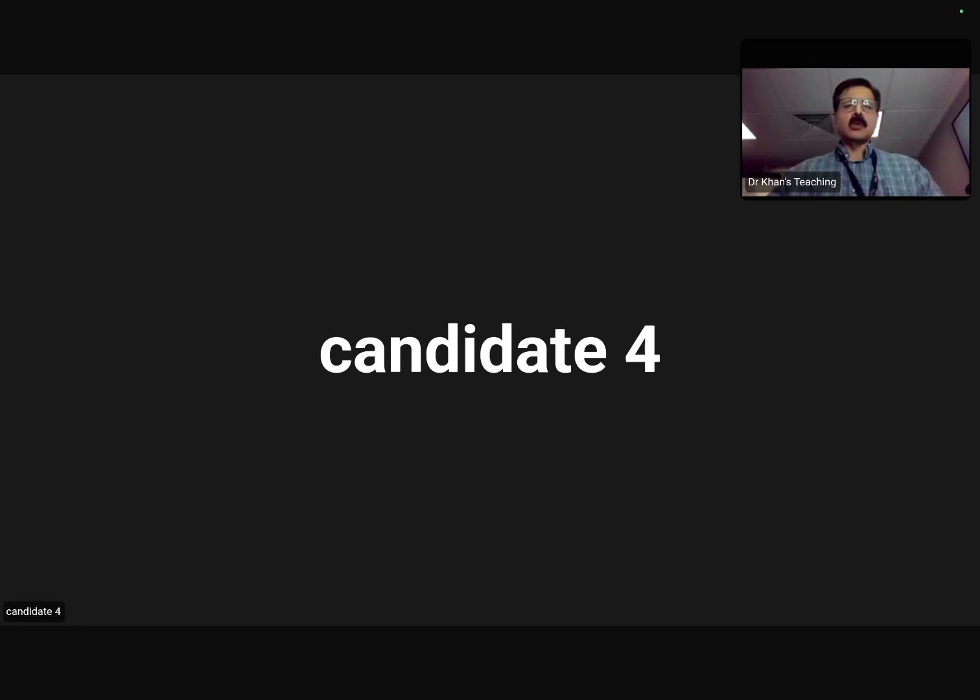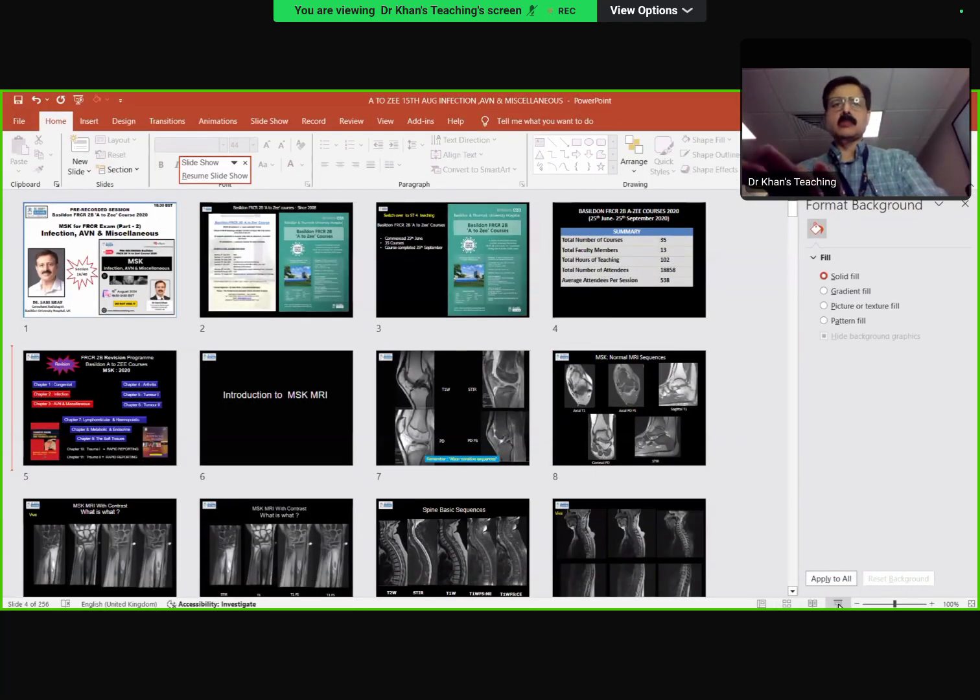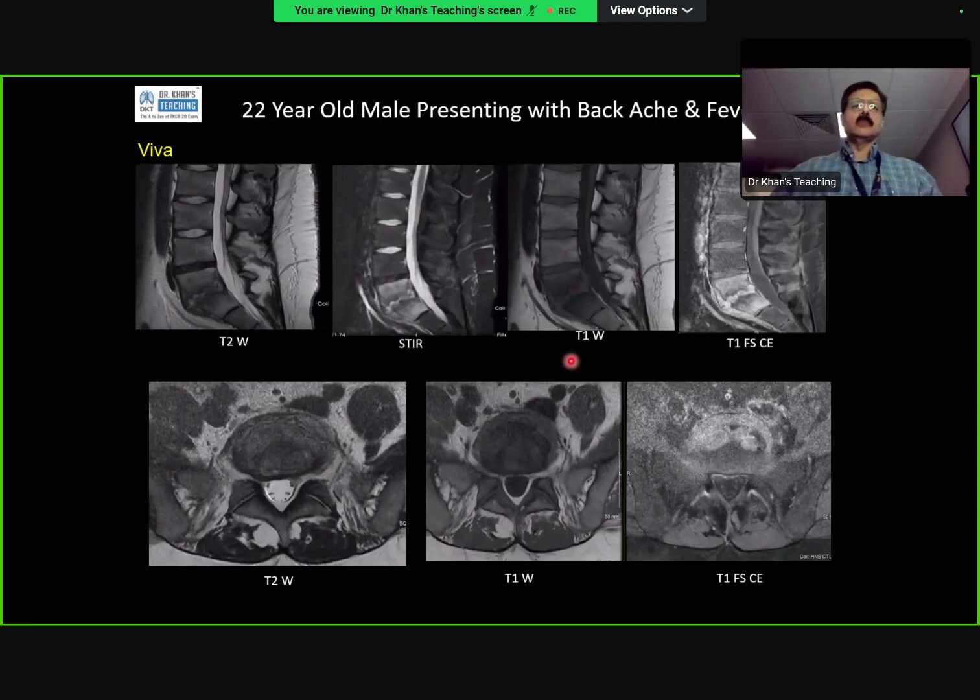Well done. So, candidate 4, are you with us? Yes, sir, I am here. Okay, so let me. Okay, candidate 4, just concentrate on these sequences. I have given you actually what it is, and describe the findings to me.